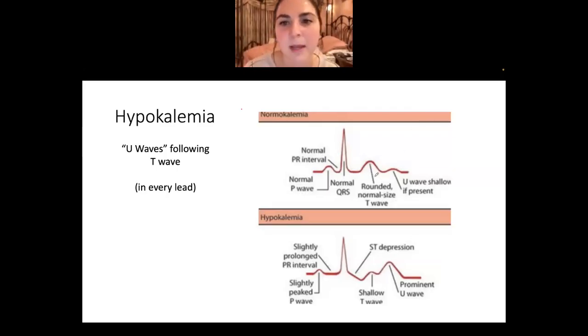So the U wave, just remember U comes after T in the alphabet, T, U, right? So that's the point of the U wave. It's just this little bump after the T wave, but before the next P wave. I wish this showed one more so you could see it would be like this and then another bump. Oh, it's not bad. It's a good one. Not great though. There's a double little peak.